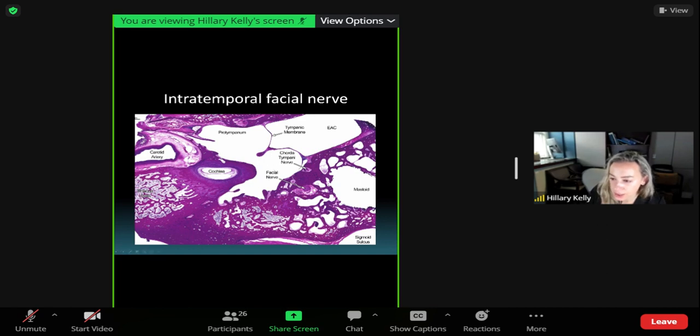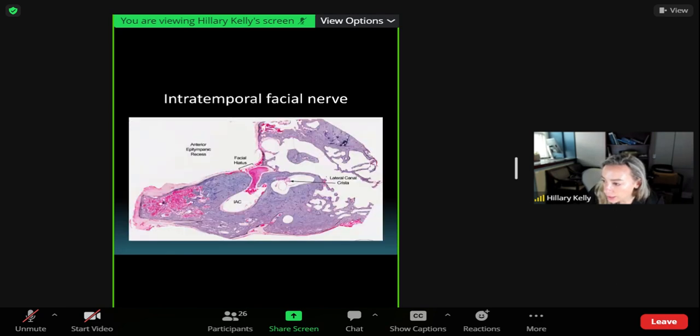That's the chorda tympani. All right, so on MRI, the intratemporal segments of the facial nerve can be more difficult to identify. But from your knowledge of CT, you can find it. So here we see the labyrinthine and geniculate and anterior tympanic segments of the facial nerve. All right, it's got that sharp turn. Here's that facial hiatus, and that greater superficial petrosal nerve is going to come out here. All right, on the coronal, it can be harder to see, but here's your cochlea, your snail, and then the two eyes, right? So you've got your labyrinthine and tympanic segments there.